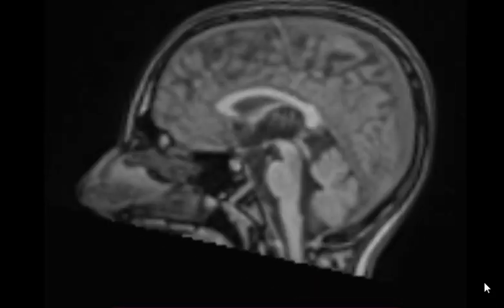So this is a 12-year-old male patient presented with disturbed level of consciousness, some abnormal movement, delayed milestones, things like these. Okay? So brain MRI was ordered for him. What's this exam?